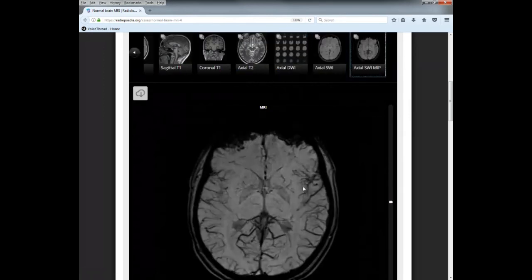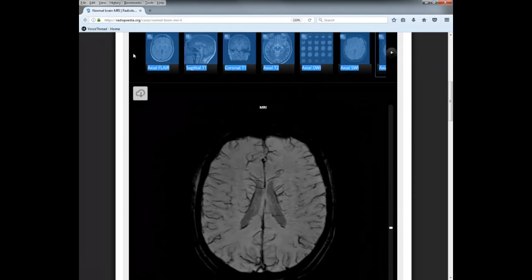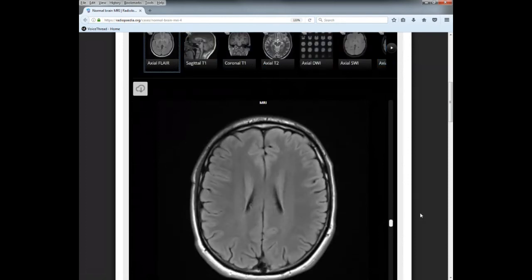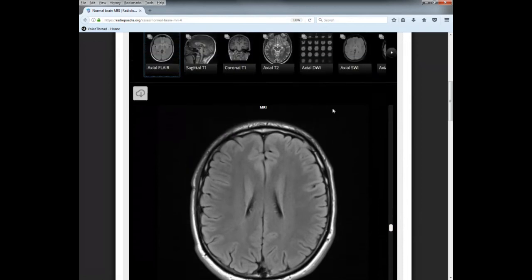Axial MIP doesn't look really good. It's not easy to see the anatomy. So unfortunately, I have to show you the axials in this flare. Okay, so just again, write down on a sticky note that the actual coloration is opposite on the axial flare.